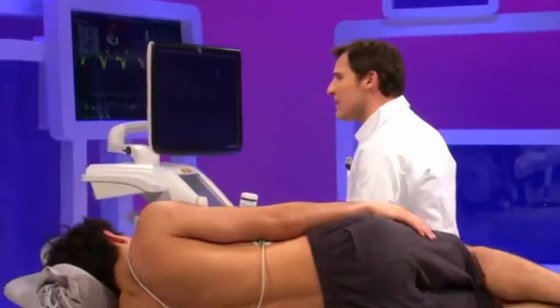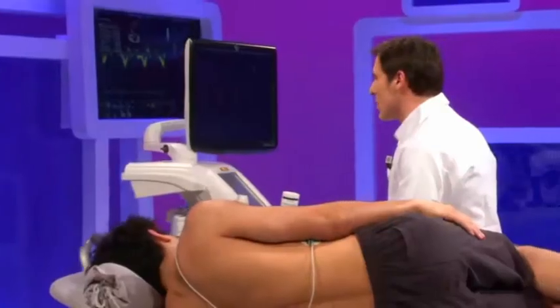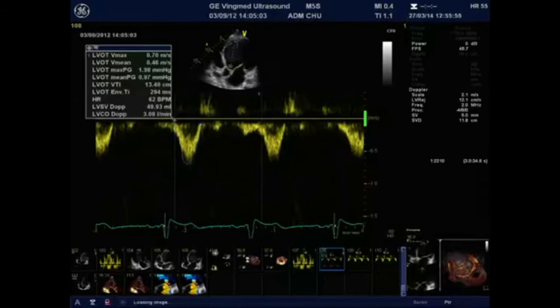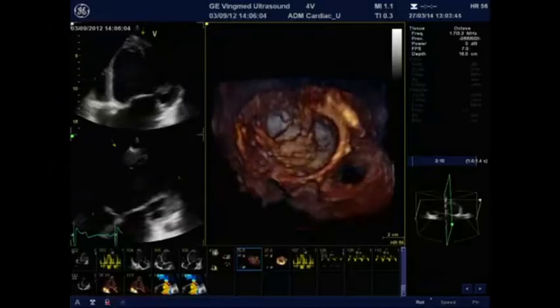So in other words, if I have to conclude, I would say that we have a patient with severe mitral regurg that is secondary due to a significant remodeling of the left ventricle and significant changes in the mitral valve deformation. Just to illustrate all the effects of the remodeling process on mitral regurgitation, it is of interest to use 3D echocardiography. Even if it's not the scope of the presentation, this is just to show you exactly the impact of the remodeling process on the mitral valve leaflet.